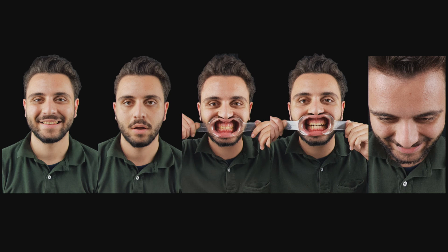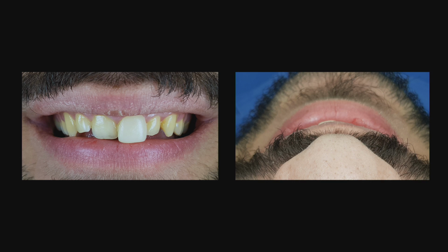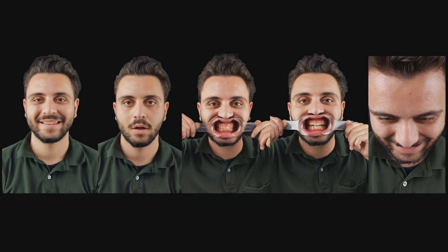Yes. So to summarize the case, as we see now, can you see the picture of the case? Dr. Iliev took 5 pictures, and then corrected one central by adding on the buccal surface, so that now you can see the vestibular part of the tooth. Because if you go back and look at the 12th position, the last one, you cannot see the central.